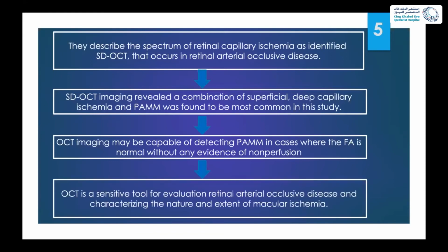And also OCT is a sensitive tool for evaluating patients with retinal artery occlusive disease and characterizing the nature and extent of macular ischemia. You might have patients with paracentral acute maculopathy and a normal fluorescein angiography, but with time, this patient will develop a full picture of retinal artery occlusion. So OCT can be a very good tool to screen a patient with vascular disease.